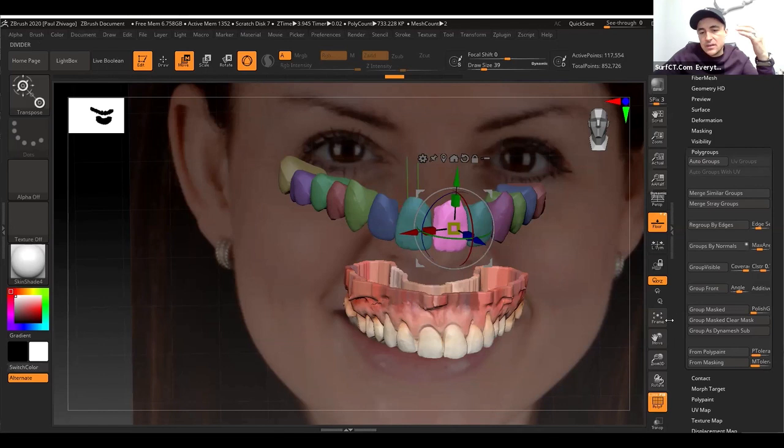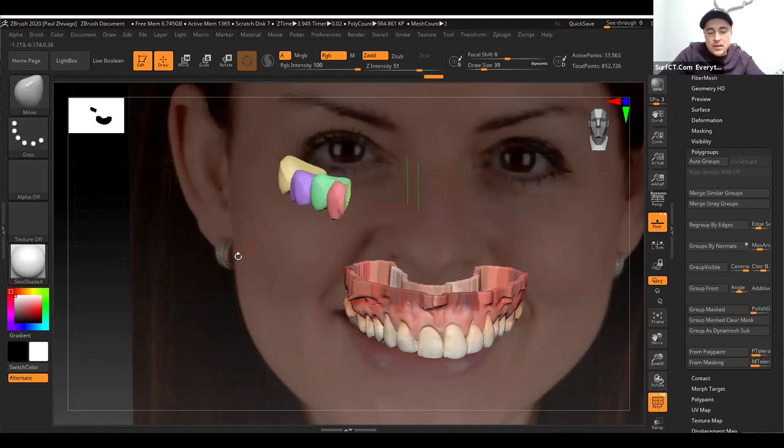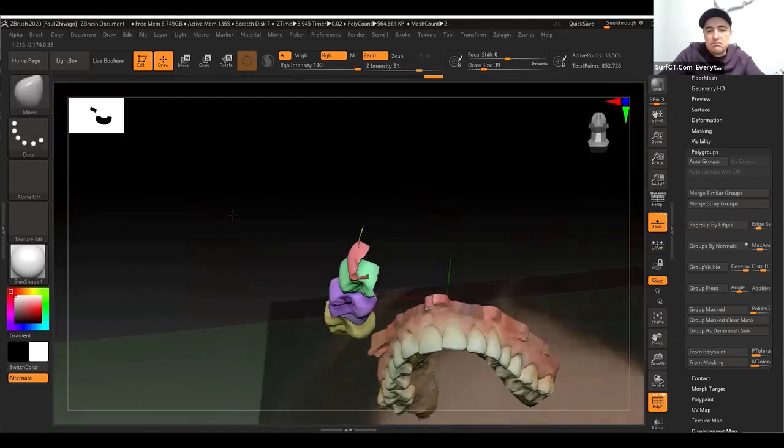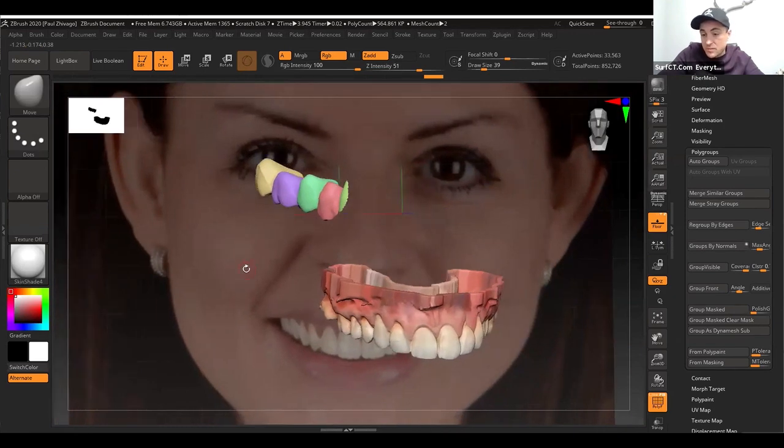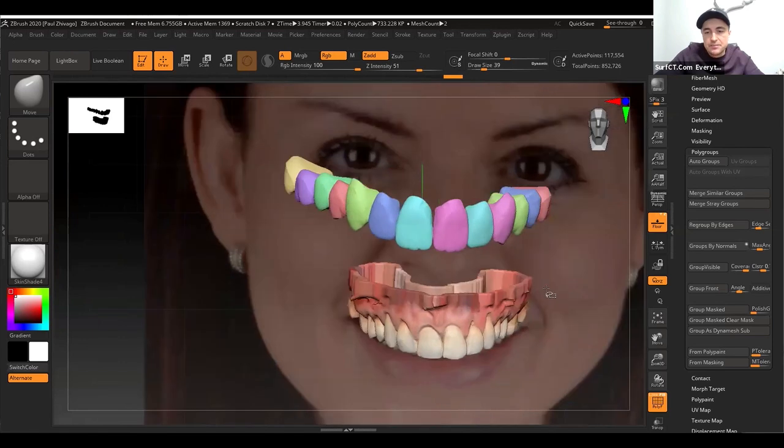Now there's even a much nicer thing to this. So let's unmask this. Unmask is Control and pull like a square outside. When you go to draw mode and you go to the select lasso thing, you remember that you can click on stuff and then it shows you only whatever you decided to select. You click outside and everything goes back.